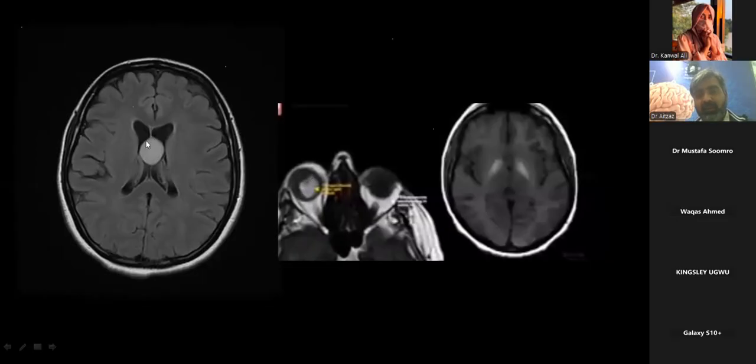Okay, optic glioma. And this one? Optic glioma, sir. This is glioma. Okay, and this one? Probably Fahr sign, the calcification of the basal ganglia. Which sequence is this? This is probably T1. Yes, this is T1. Previously we talked about T2, so this is T1, not T2.